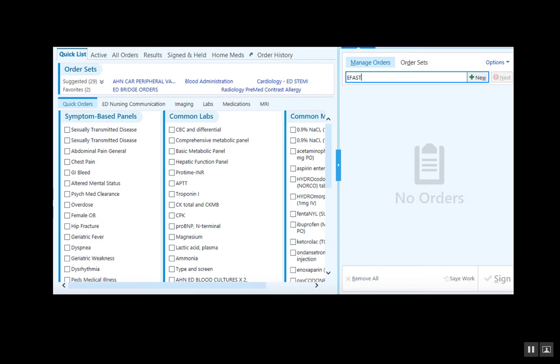This is a video on how to order bedside ultrasounds at Forbes. Once you place your order, this will also illustrate what to do next in terms of how to get the patient information from the machine, save the images, and have them stored into PACS. This should be a pretty common view to everyone.